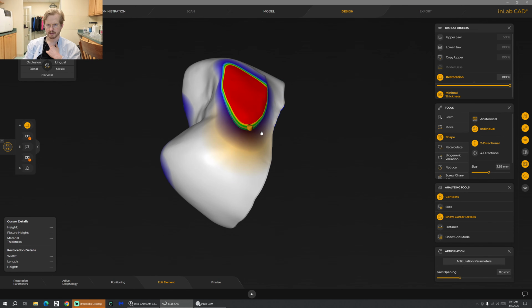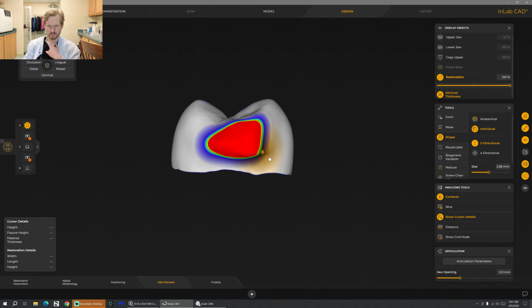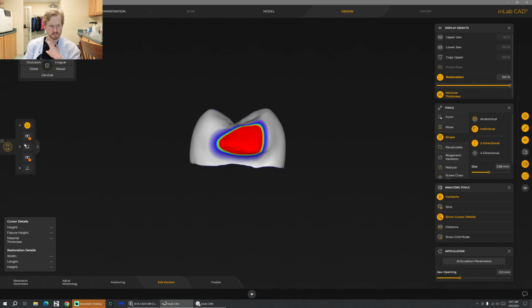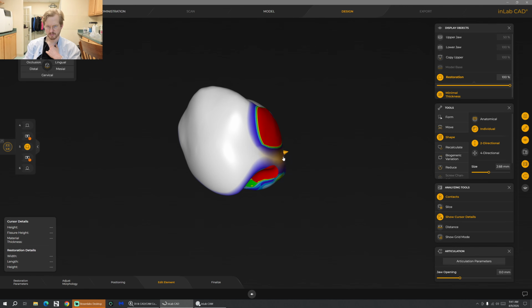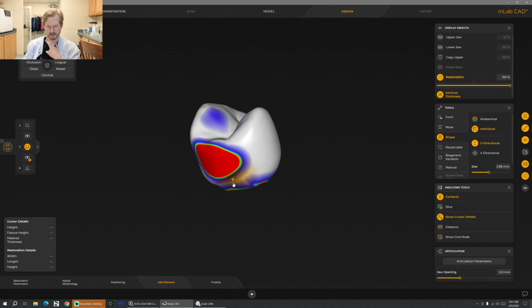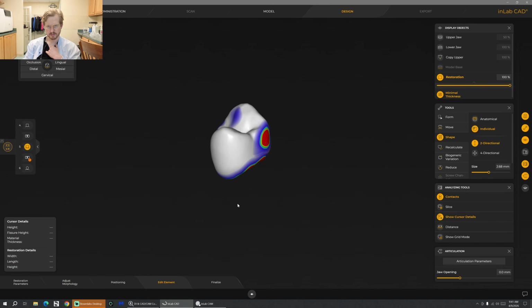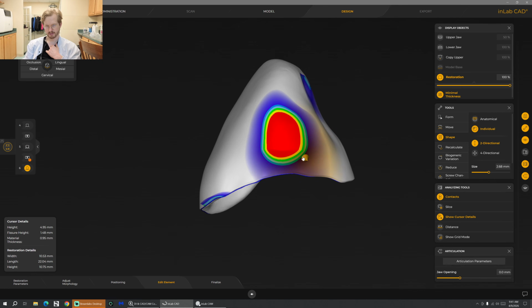Start to bring that out some. Let's go to 5. That distal 5. There we go. Now it's happy. All right, then we're going to start to do the same thing on 6. So our connector we want to strengthen.